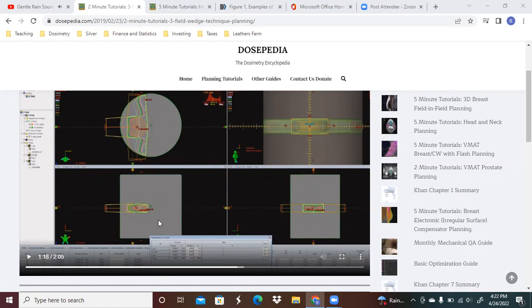And an example here of a 3D plan, a 3-field 3D plan, this obviously is a phantom, and you're looking at a target here. You've got these 3 beams put in at particular angles that you're typing in, in this case, to the Eclipse planning system. You're putting those angles in, and you're trying to figure out exactly how to cover this orange area to a specific dose. Obviously, what you've got right here is a big mess, because you've got coverage that's just slanted up here, and then you've got dose that's leaking out here on the sides.